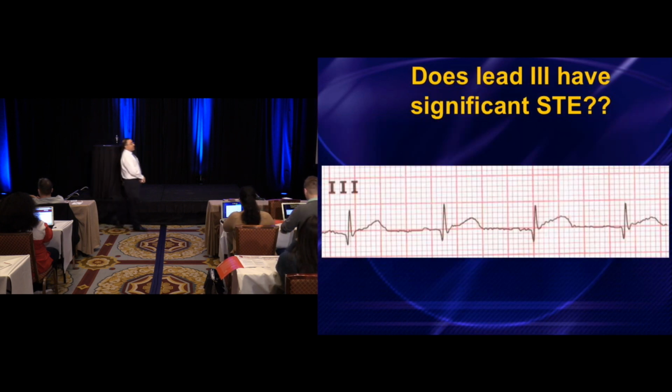Okay. Well, let's take a look at lead 3. I think lead 3 is probably the most concerning ECG lead. Based on this lead, how many of you would say this meets STEMI criteria, assuming that it was only one lead that you need? How many of you feel that based on lead 3, I'm giving lytics? All right, so a few more hands go up. How many of you say, no, it still doesn't meet lytic criteria? All right, and still a lot of people are not going to take care of this guy.